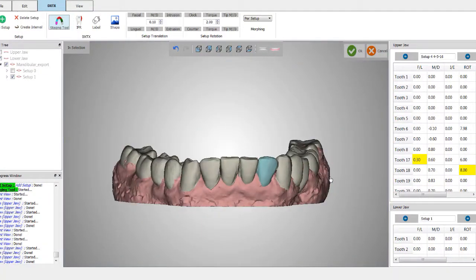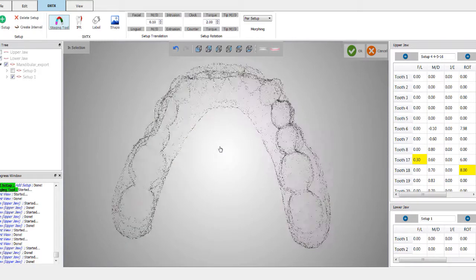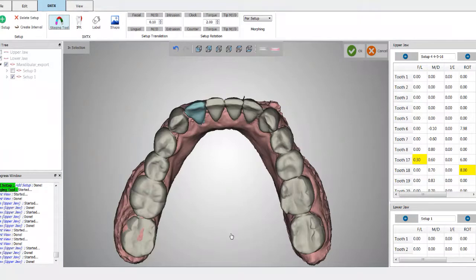So when the patient gets finished with wearing this series of aligners, you can always do refinement. So at that point, if you'd like to do some IPR here and retract those incisors, I would much rather do IPR when the teeth are aligned because I have very good access. So I'm not going to create any ledging or uneven edges. So I always like to align the teeth to ideal, and then reevaluate the overbite and overjet and decide if I need to do some IPR then. It's much easier to do it then when the teeth are aligned like this, and then just do a few aligners to retract and close the spaces from the IPR. I found it's much more consistent, and I get much better results.